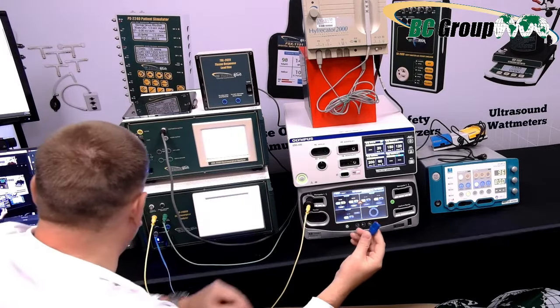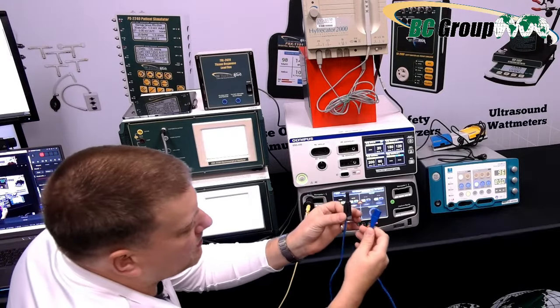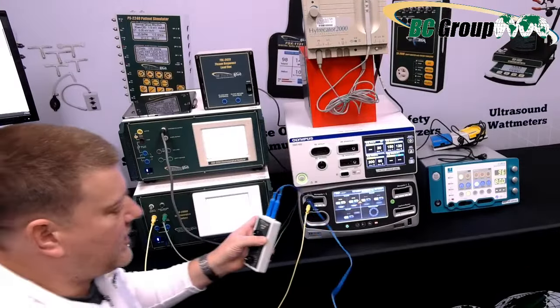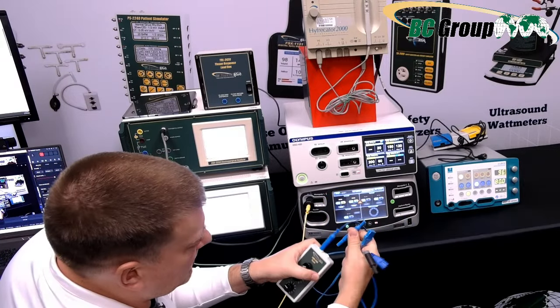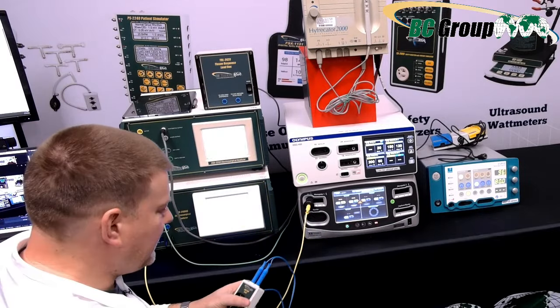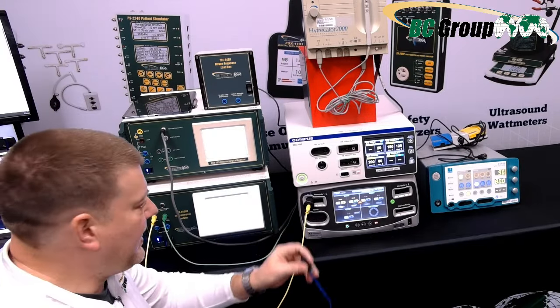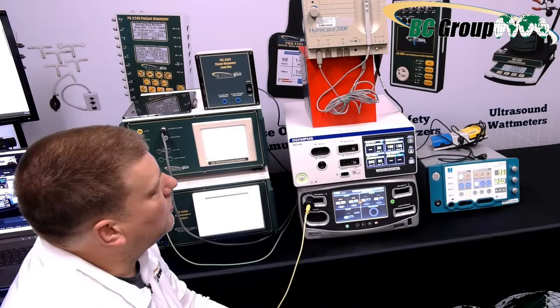Now, I have it chopped off on this guy because as part of your testing kit, you're going to have one that is joined, and we have one that is separate, okay? So this one right here is separate. You can see right here there's two banana plugs. This guy right here has a single banana plug. They serve two completely different functions. The reason that we have this one here into a single is because you want all that energy into a single point so that there's no, what would be the correct word?